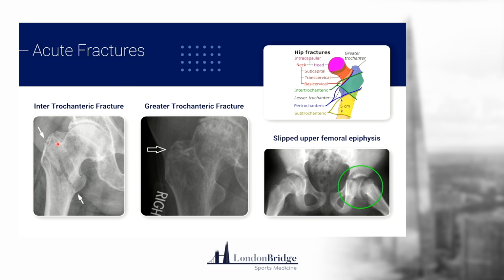So, for example, here you can see the intertrochanteric fracture line. That's the usual patient you'll see with a shortened hip, externally rotated in A&E. These you sometimes see in the athletic population, either from a significant avulsion of one of the gluteal tendons, or you can often see it on the lesser trochanter as well from psoas. So either a tendinopathic picture or a slight avulsion in adolescents as well. So X-ray can tell you that stuff if you're willing to look closely.